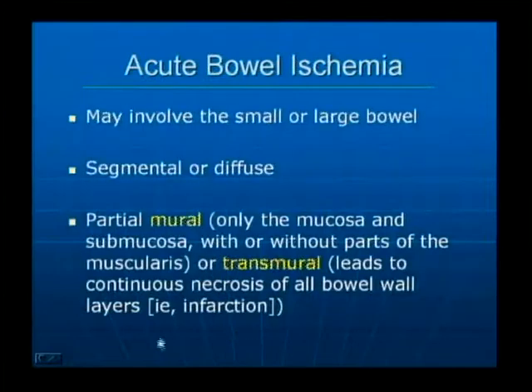And this is ischemia. I should have asked you for a differential. So this is a patient with ischemia. Certainly, you want to think about ischemia. If you just saw small bowel thickening, there's a long differential, including any kind of enteritis, including infectious enteritis. But those patients don't usually get severe pain, and they don't usually get that much ascites. Whereas if you're seeing ascites in association with small bowel thickening, you want to think about things that will cause fluid to leak. Patient's profoundly hypoproteinemic, and if the patient has pain, think about ischemia.